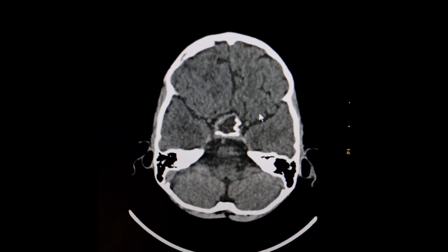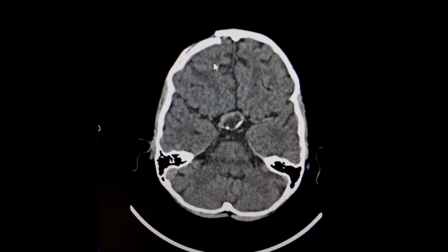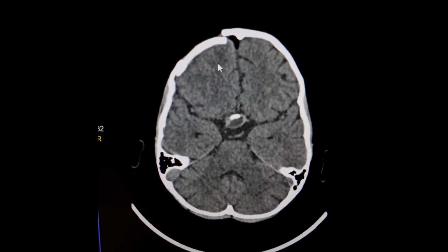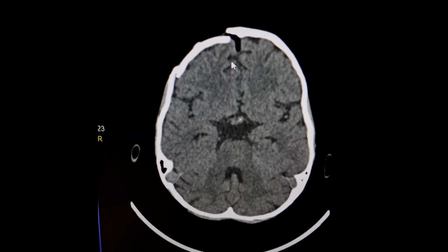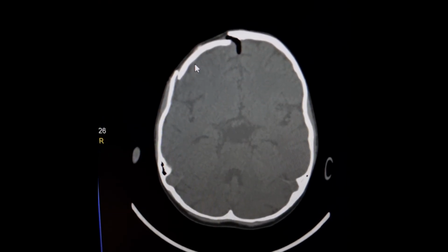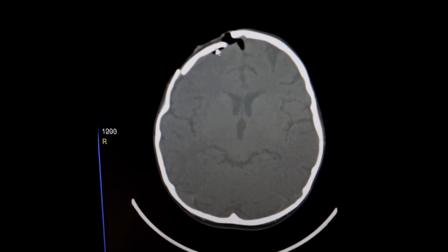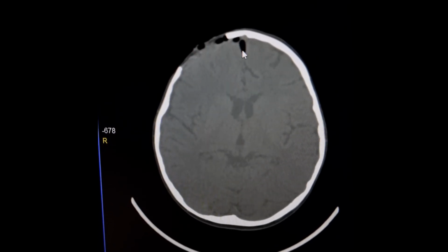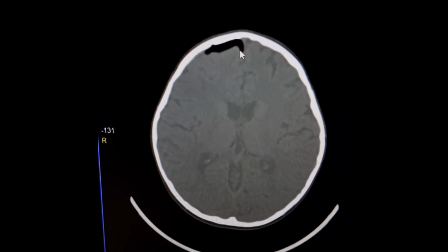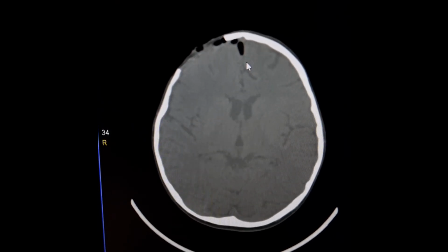Now I come on to this craniotomy flap. Please see that this is displaced inwards and downwards. There is overlapping of the bones. There is pneumocephalus. Air is entering from the skin wound intracranially and comes to lie along the anterior surface of the right frontal lobe and in the anterior part of the interhemispheric fissure.